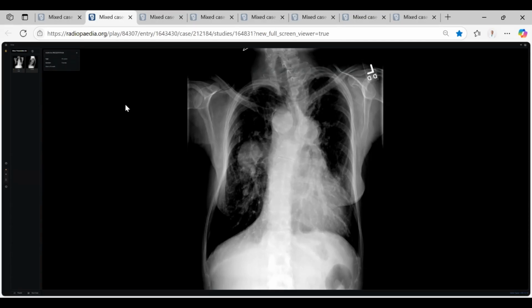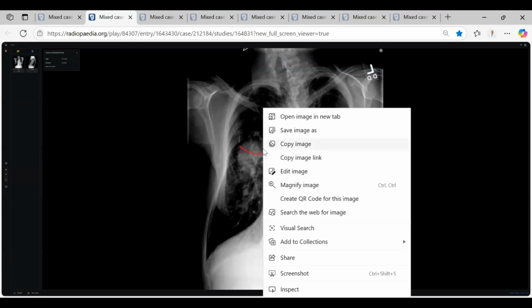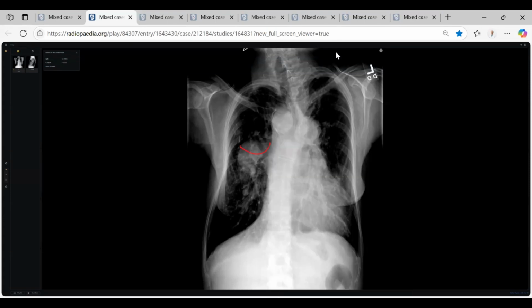Apart from that, there are a few other nodular opacities. So it's more than 3 centimeters. It's concerning for me in an old age patient whose lungs are hyperinflated. It can be a malignant mass. I am checking for other lesions in the lung parenchyma as well. What will you do next? I will go for a contrast enhanced CT scan.